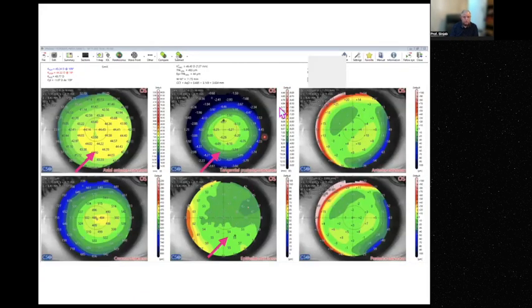And here is the left eye. As you see, this is the crab claw. The posterior tangential map is concentric, there is no anterior superior asymmetry. And here we don't find focal thinning. This is even thickening. This part is thicker than the one above. So most probably this is because of dry eye.